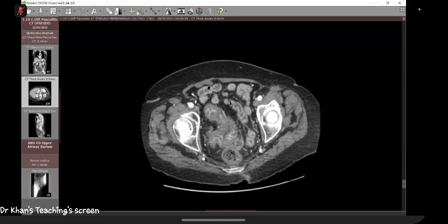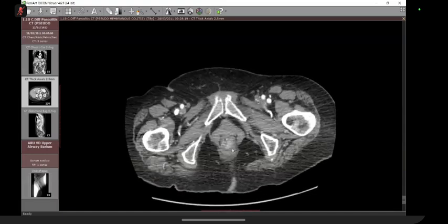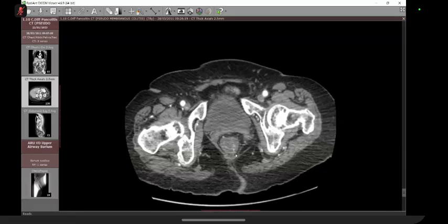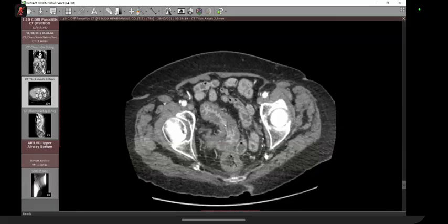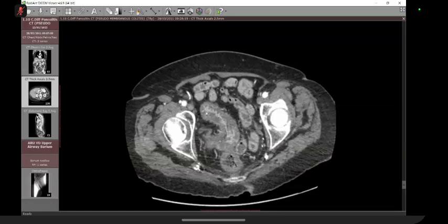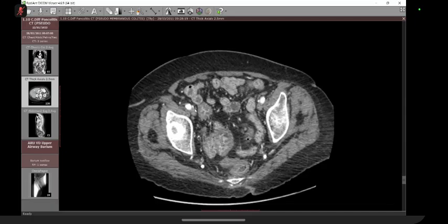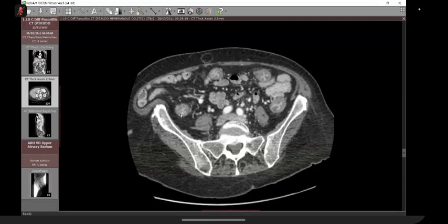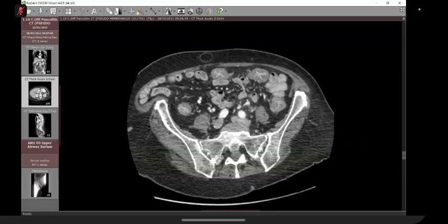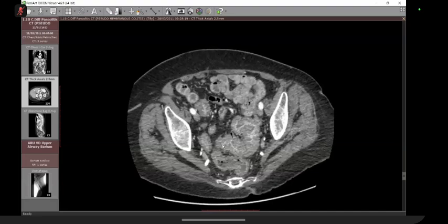Now, we are going to trace, this is a case of pancolitis. And our role is to look at what is happening in this CT. So we are in the rectum, in the sigmoid. Do you think this is normal? Mucosal thickening. And where my mouse is, let's trace it. This is a very good example of large bowel which is difficult to trace, because the region which I was tracing was actually a redundant type of cecum.